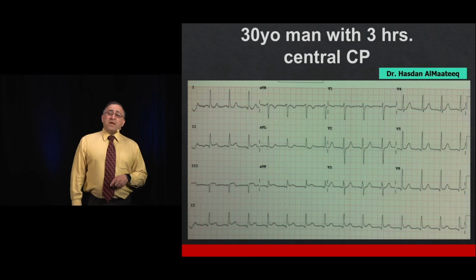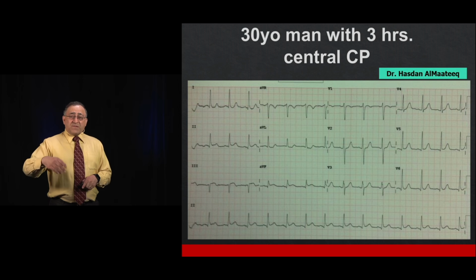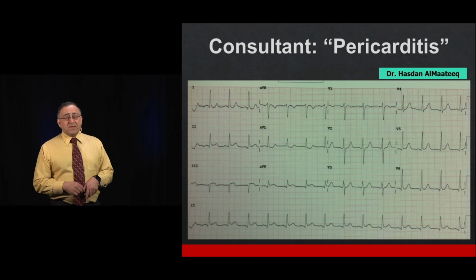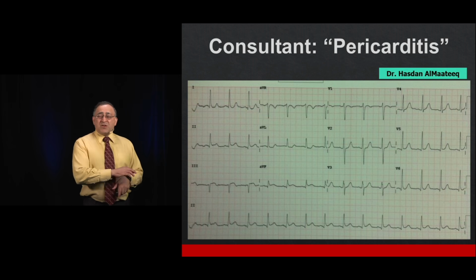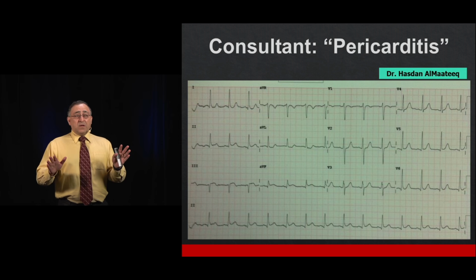How about this one? Here's a 30-year-old man who's been having chest pain for 3 hours. 30 years old. It's awfully young. The physician here was worried that this was an acute STEMI. He contacted his cardiologist, and the cardiologist said, no, this has to be pericarditis. He's too young. Again, true story.